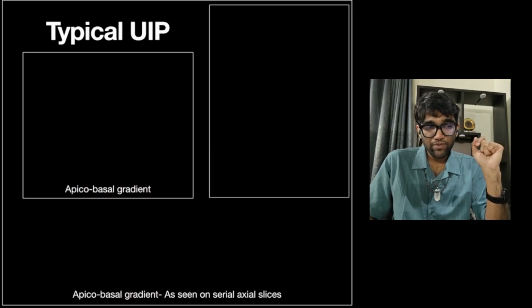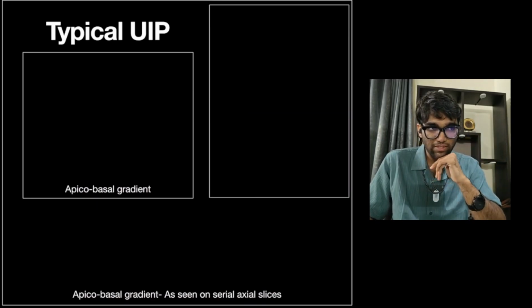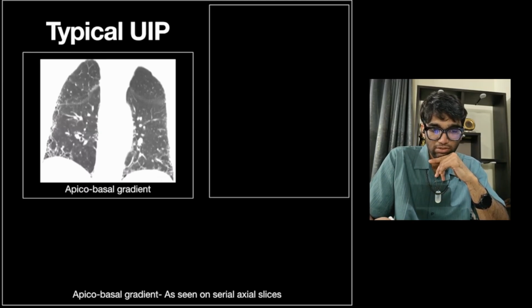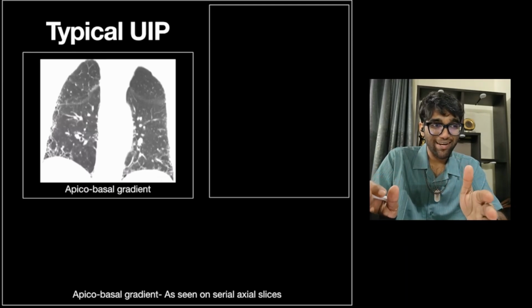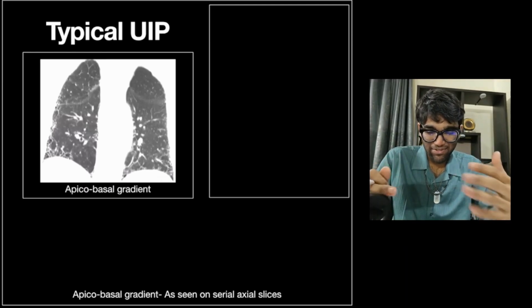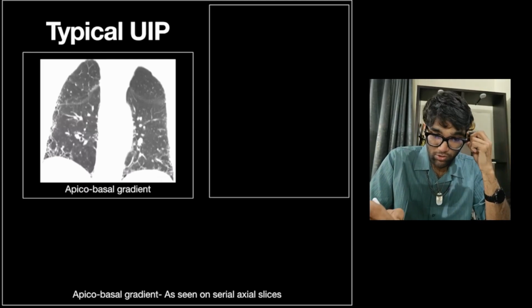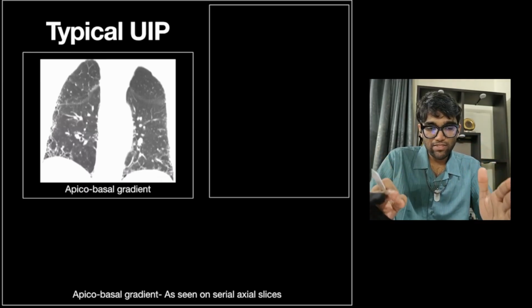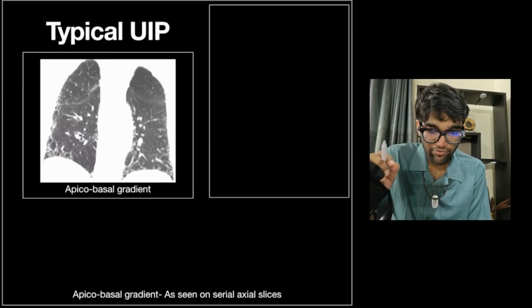Okay. Now let's go through some images that demonstrate these 3 buckets of patients, or 4 buckets of patients. So this is the first HRCT that we'll see. Here you can see this is a coronal acquisition. The windowing has been done in order to show you the parenchyma properly. Sorry, the terminology from flow cytometry is coming in here. So anyway, a coronal acquisition has been done, and a coronal image has been shown to you, and windowing has been done such that parenchymal structures are clearly differentiated from one another.